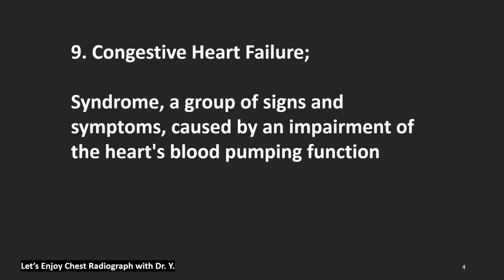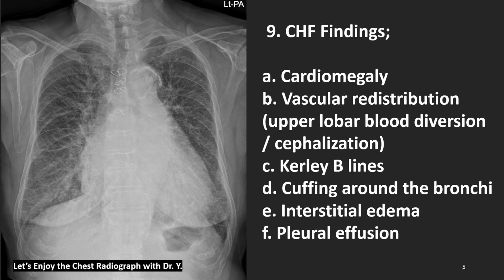Now let's begin our new topic. It is about congestive heart failure. Congestive heart failure is a syndrome, a group of signs and symptoms caused by an impairment of the heart's blood pumping function. Congestive heart failure's radiologic findings are like these.